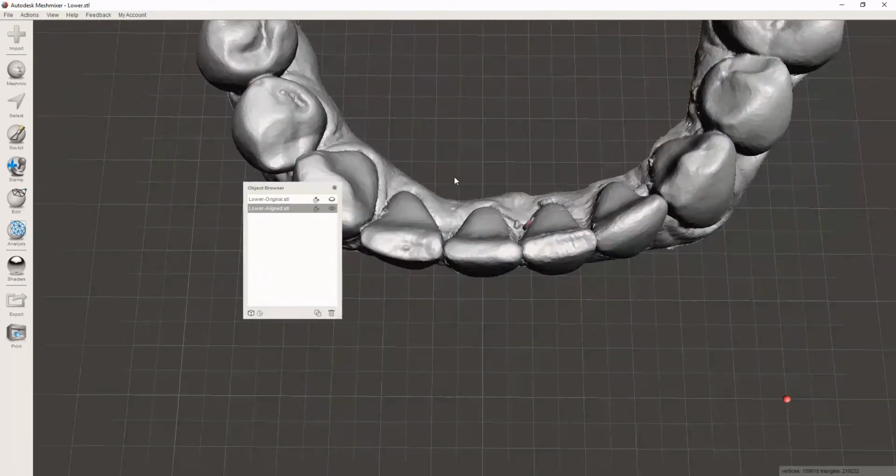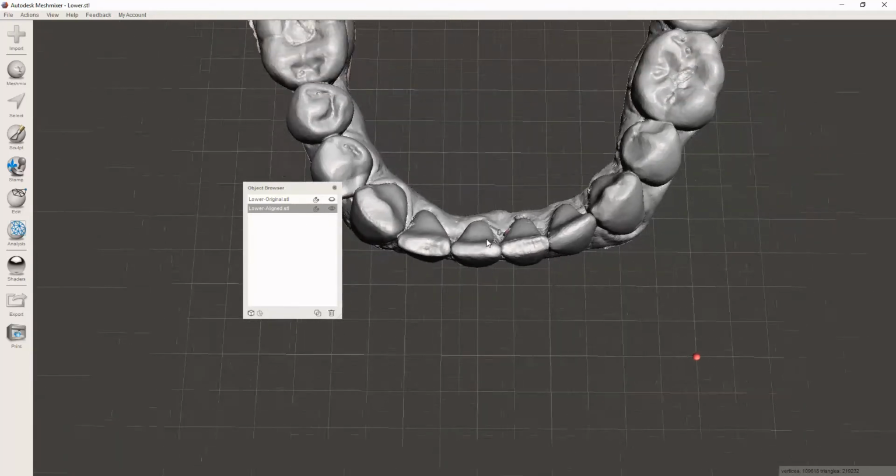So now we've got our before and after. But now, how do we actually make a model? Because if I just make a suck down off of this, it's not going to fit. It's going to hurt like crazy, but it's never going to fully seat. It's too much movement. You can do it with very minor movements, just do it that way. But for a case like this, we're probably going to have to use a number of retainers to progressively move the teeth.